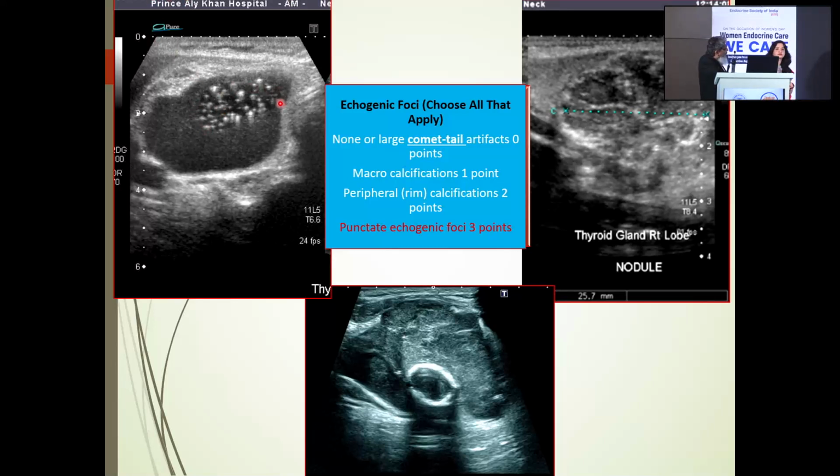This is a pure cystic nodule, which is black but not solid because there would not be any vascularity in this, and we see calcific looking specks, but these are not calcification. These are typical crystals which give rise to artifacts. So when there is a short artifact seen here, it would be labeled as a comet tail artifact. The moment you see a comet tail artifact, it is almost considered 99% benign, except for nodules where a comet tail artifact can occur in some cystic portion within a nodule which has otherwise become malignant. So this is one important comet tail which we should all know.